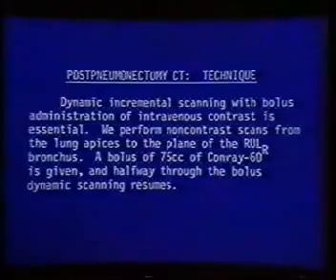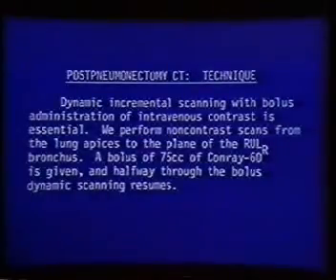And I would also like to point out with this application, and even going back to something like empyema versus lung abscess, that CT is not tissue specific. It's not making diagnoses such as this is an empyema or this is recurrent tumor. What it's doing for you is identifying abnormality, giving you an idea where the abnormality is located, whether it's pleural or parenchymal, and telling you you probably ought to go after this to get some sort of other confirmation to indicate the presence of tumor or the presence of infection. So it's not specific, but it does show you where the abnormality is and guide you to what needs to be sampled.